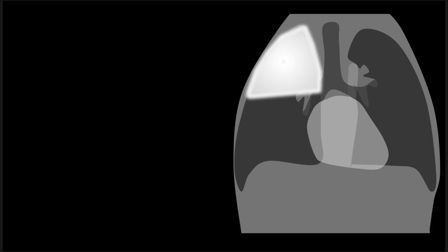You can have pneumonias that have a non-segmental lobar appearance. Now I use the word non-segmental on purpose. If you're seeing white stuff that follows a strict segmental distribution, you might be thinking about a volume loss process, and we're going to talk about that. Atelectasis is the fancy word for that, in a dedicated talk.